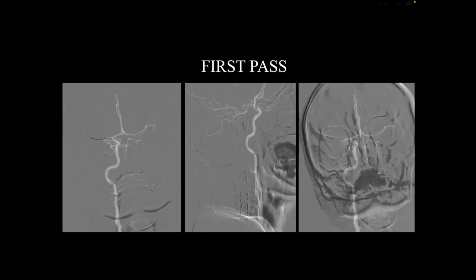The patient underwent a mechanical thrombectomy by the Solumbra technique, but we won't be discussing the details of this since this is an angio reading session. The patient had a good outcome and made a near total recovery.